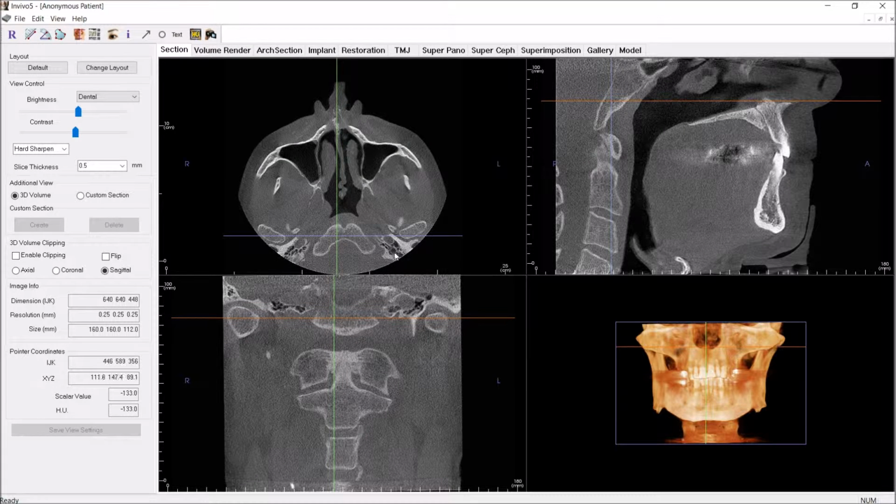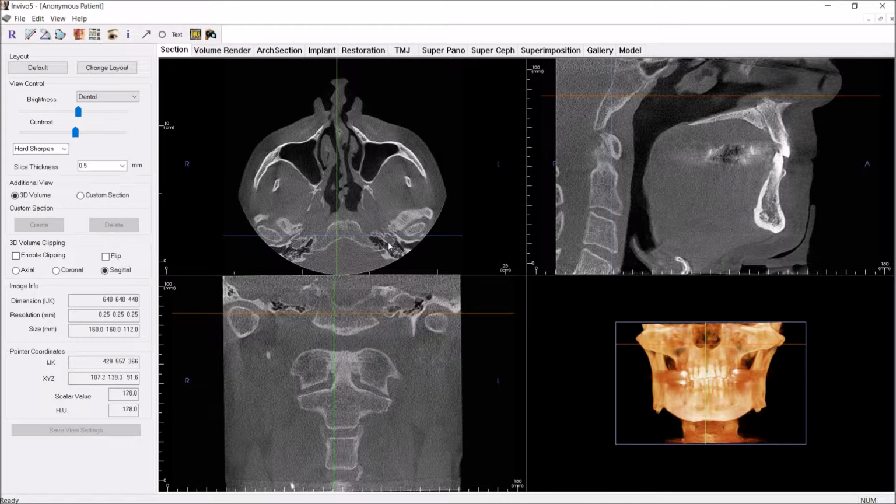So here we see these are completely black. So if it's completely black, that means it's air. So this has to be something filled with air, and these are just the mastoid air cells, which you'll see more posteriorly, but frequently like this, they will aerate more anteriorly into this part, which is called the petrous portion of the temporal bone. Petrous meaning rock-like because it's hard. And this kind of stands out as different from the rest.